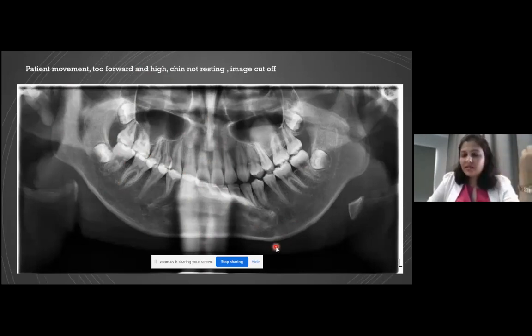Now, for those who are paying attention, you would have noticed something here. I know it's difficult to notice it. You wouldn't have paid attention to that. That's a maxillary sinus polyp, also called a mucocele. A lot of us have it. It could be an incidental finding, and unless you're having a stuffy nose, it can be ignored.